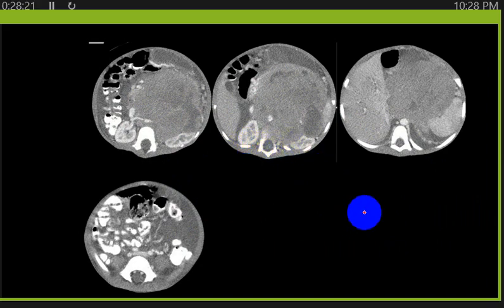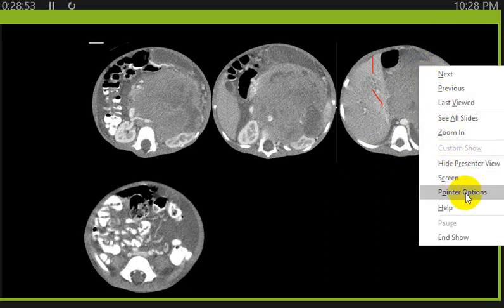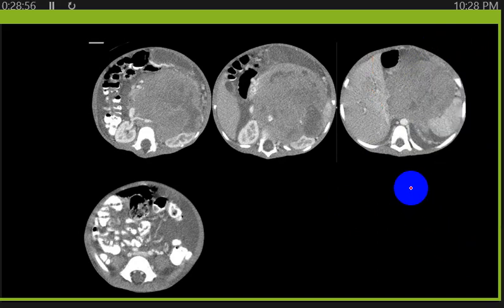Liver. So my top differential diagnosis. Is the liver involved or not here? I don't see any obvious lesion, but some hypodensity is seen in the right hepatic lobe, more anteriorly. Okay. So my top differential diagnosis is neuroblastoma with hepatic metastasis. Okay. If there is hepatic metastasis, what do we call the stage here?